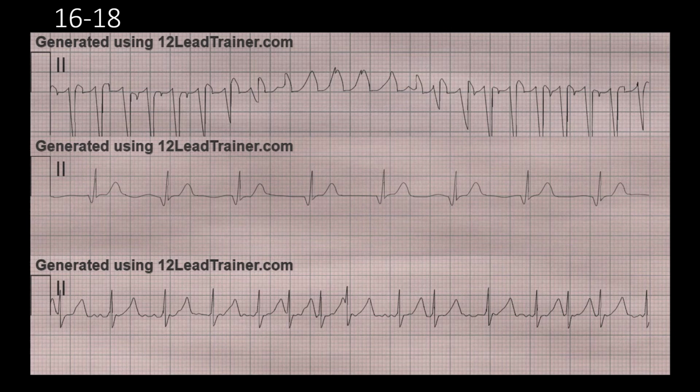Alright, so for this one, the top one, you could say maybe regular or irregular. I'm not too worried about its regularity with this one, at least. It's kind of hard to tell for sure. Also with the rate, I'm not too worried about that. You could check it if you wanted to. It is closer to the 300 range, about. No P waves that we can tell, so we can't check a PRI. The QRS is a little wide, and in some areas it doesn't look so wide, but there is definitely a changing pacemaker location.